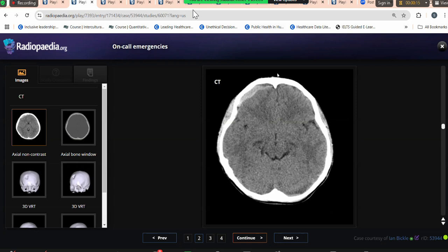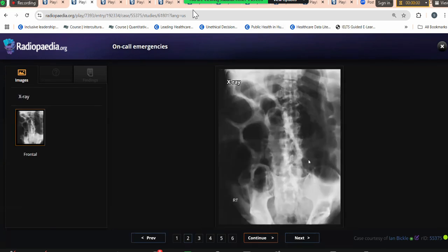After this, what did we have? Yeah. So this is the one in which I started with the X-ray. What I wanted to say, you said it very nicely that you can see the history. So what I wanted. Sorry for interrupting. Could you reshare the screen? Oh, sorry. Yeah. Thank you for letting me know.